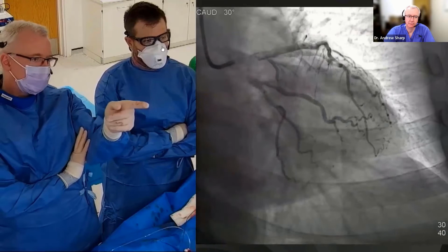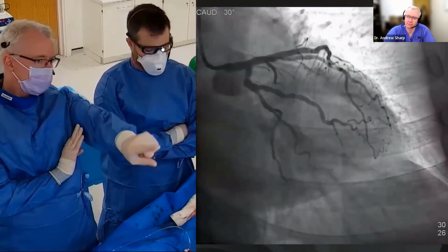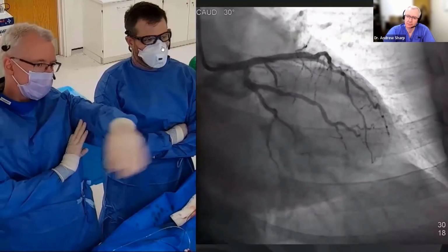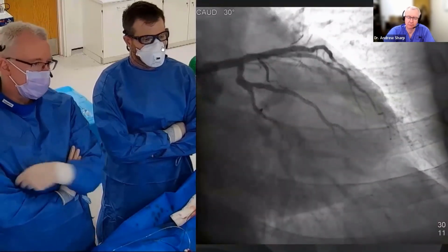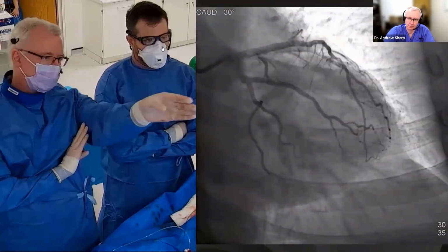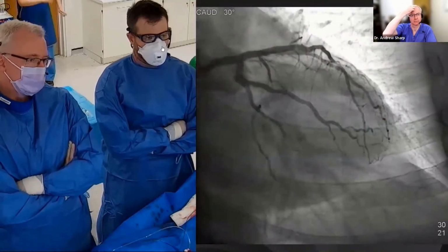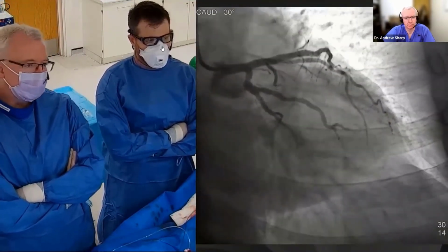And you see in this view how shortening the stent has made such a difference. Yep. We've avoided that kink where it goes down into the myocardium. It's a little hazy in the intramyocardial segment, which we've seen was fibrotic disease on the IVUS. So the chances of this stent lasting, if it goes round that bend and into that much smaller segment, are lower. I think it's a great example.